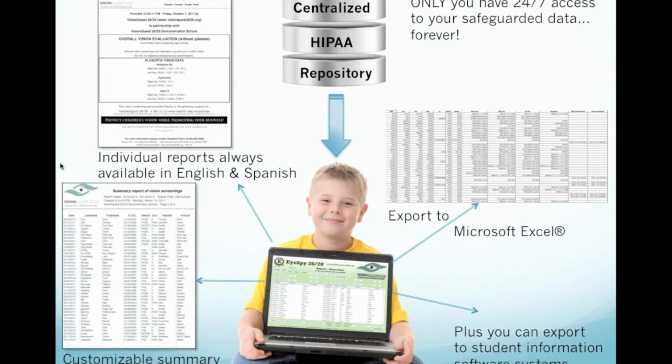And here's a really important point, I guess, is that we can design the exporting into student information software systems for any system. We have the data, and so all we would have to do is know what format, for lack of a better term, the particular software system is looking to read, and then we can develop the software routine to export it into whatever system a school or a state would like. So there's no limit to the exporting capabilities that we would provide.